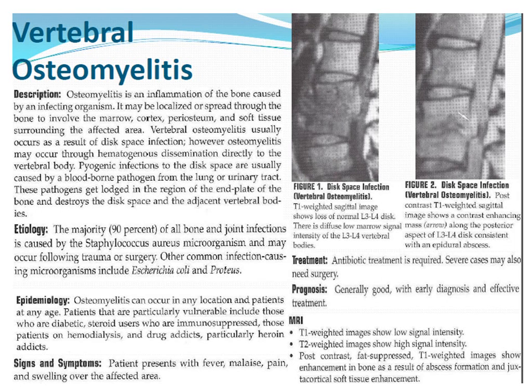That's a signal that this isn't just average degenerative disc disease, that's really bad. This is discitis osteomyelitis. And if it's gotten so bad that the patient has developed an epidural abscess, you may see an abscess that's encroaching into the epidural space and causing compromise of the canal. In this case, they gave contrast, which is really helpful to help you identify an epidural abscess, because sometimes they're not always this large and they're difficult to see.